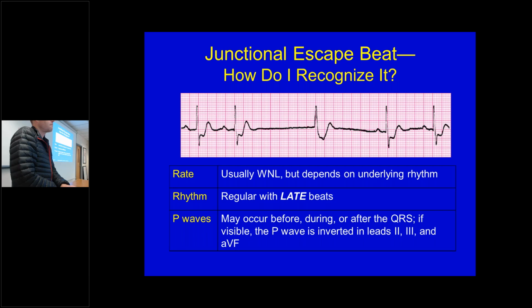There's not going to be any P wave. There's not going to be a P wave? Yeah. It depends on why it's being arrested. You don't see a P wave here, at least. Not very well, because why? Where's your P wave? It's buried. Probably there.